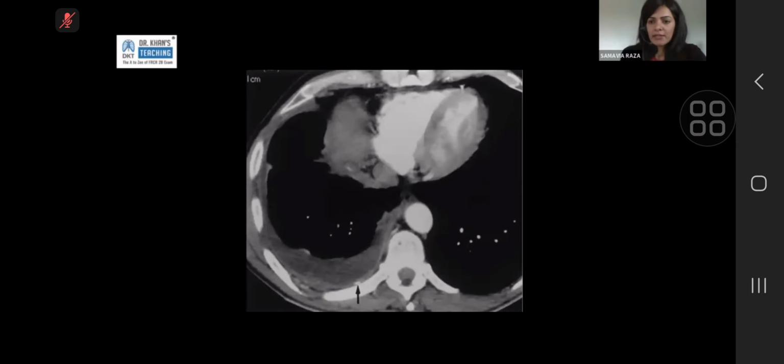When you see pleural thickening in a scan that wasn't there on the previous scan a few months ago, or there isn't a previous available, these features that you look for become very, very important, because if this patient has primary pleural malignancy, it will progress very, very quickly. You do not have time to do a follow-up. You need to recommend something now.